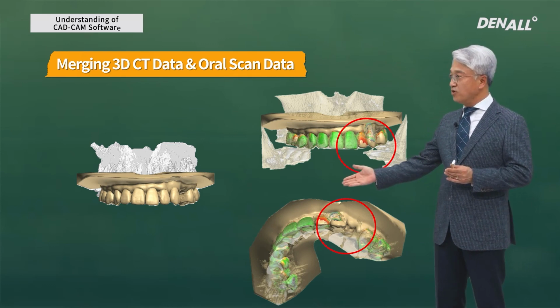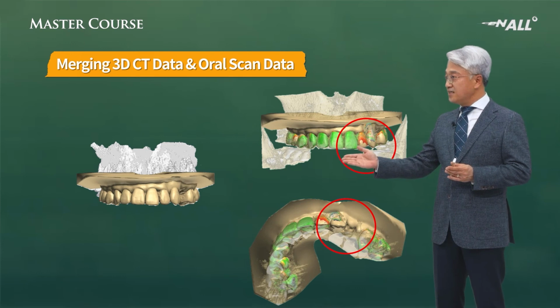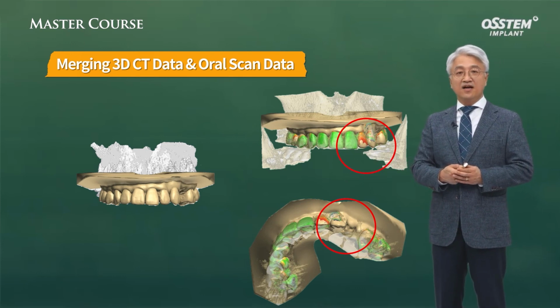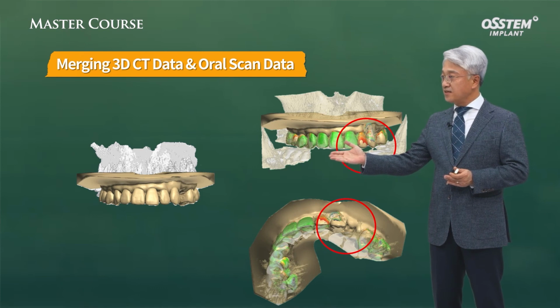the matching of other teeth are very good, but in the case of number 22 and 23, because it has been moved with orthodontic treatment, they are not matched. The CT is taken before the actual orthodontic treatment, and the setup is different. Therefore, they are not matched.